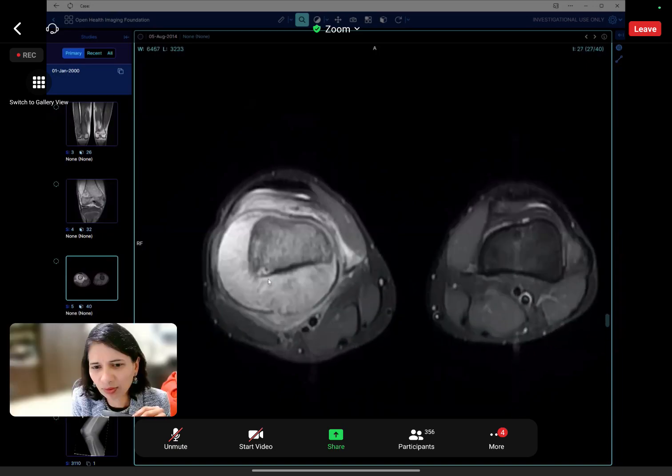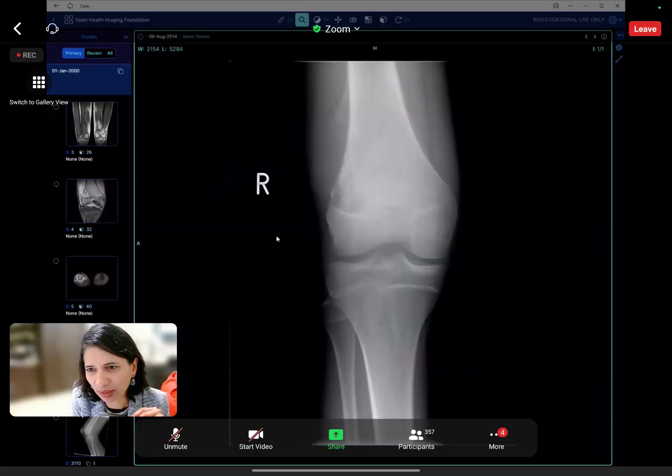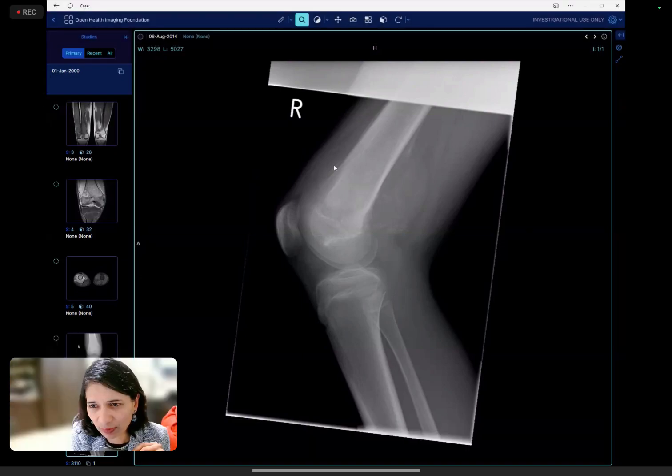Okay, fine. So what we'll do is I'll just describe this lesion. You pointed exactly correctly on this Codman's triangle, aggressive periosteal reaction. There's increased sclerosis in the bone, and there's a big soft tissue component to it. You can see the periosteal reaction here, which is very immature.